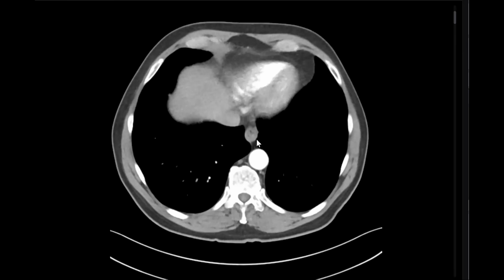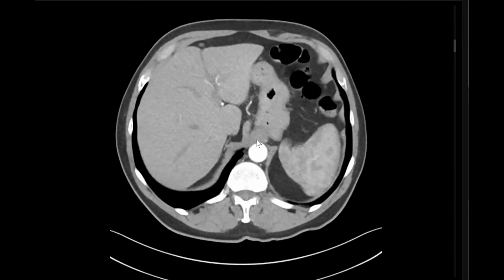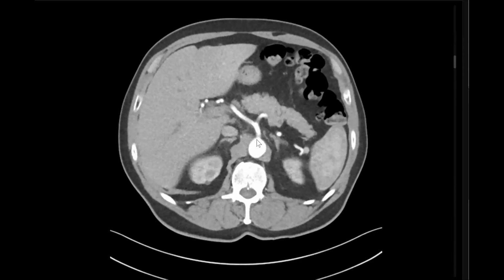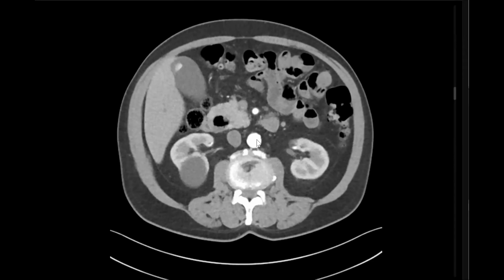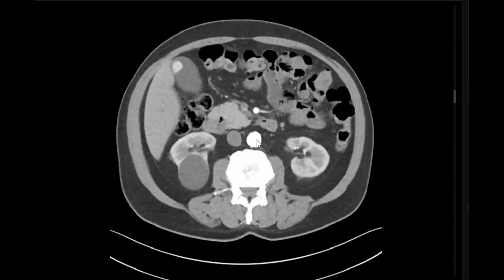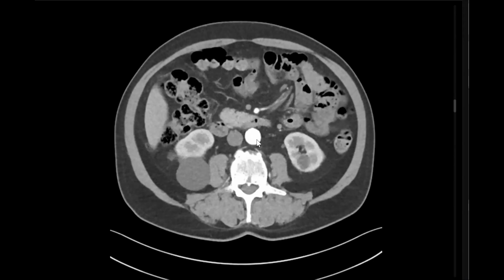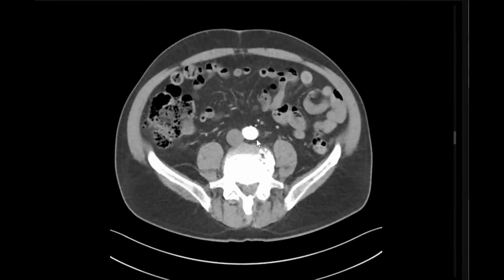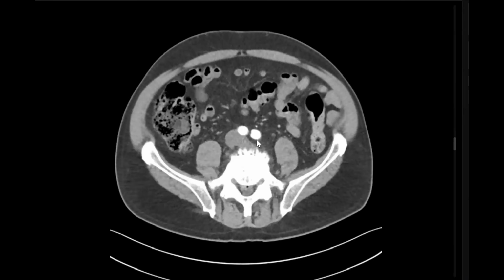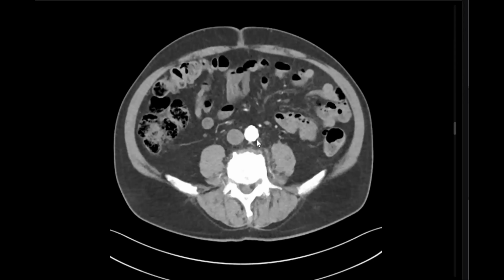So bleeding is an important emergency case also. Basal lung cuts look normal: no lung nodules, no pleural effusion. So I will go down, start from up to down. You should mention the phase. Which phase is this? Arterial phase. Incidental right renal cyst. There is a calcular stone in the gallbladder also. Pancreas looks fine. Other kidney looks fine. So I will go directly to the colon, and assess the colon step by step. Very good.